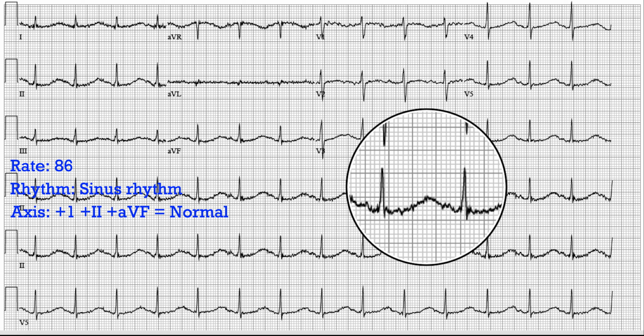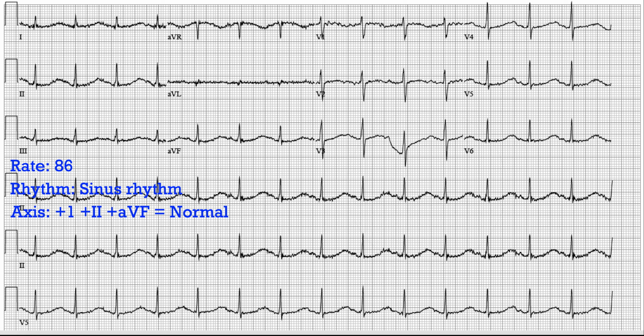And in fact, the QTc on this one is one of the longest I've ever seen. It was like 670 something. So this is a very prolonged QT interval, and that just predisposes you to arrhythmias and all kinds of stuff. If I see this person presented after a syncopal episode, I would probably put pads on this person and pull out the magnesium and get ready to start sprinkling it on them whenever I get the chance. But this is not about that. This is about EKGs. So we'll call this a normal PR interval, normal QRS interval, and a long QT.